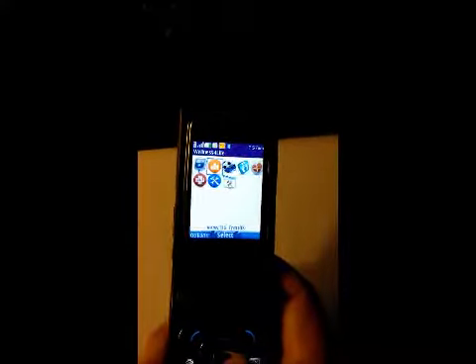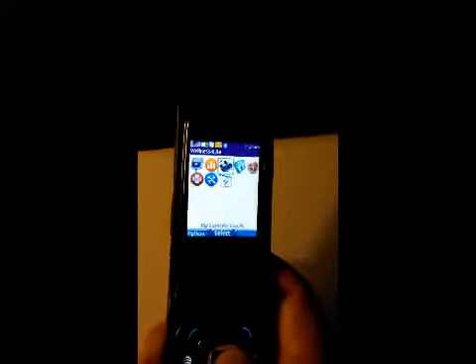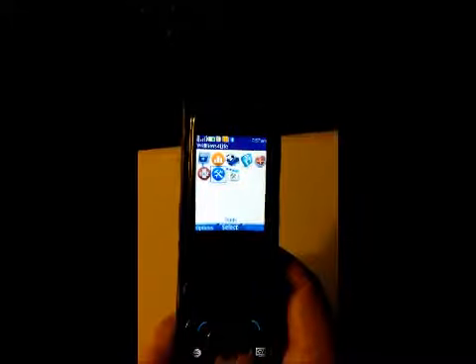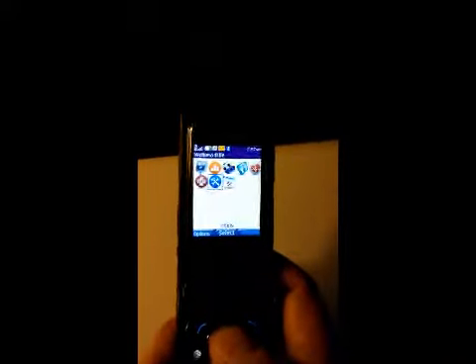So here we have on the very first icon, it says submit blood glucose. It's a picture of a meter. The next one, as you can see, it says view BG or blood glucose trends. The next one we have my exercise coach to be able to measure steps. As it turns out, many of these small little phones or feature phones have pedometers built in them so that you can measure people's activities. This one just happens to have a weight coach because that's in my program. We have a heart health coach. And then here's a button which is an on-call. If there's an emergency, it will then directly connect with the providers. And then there's various settings.